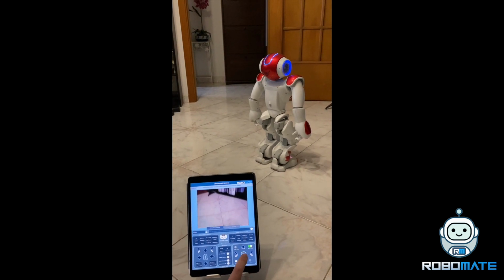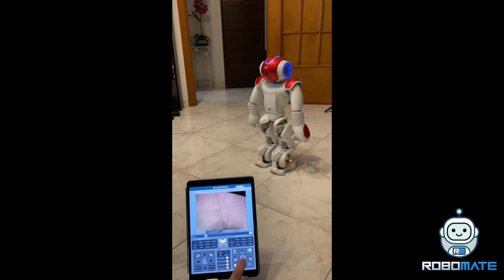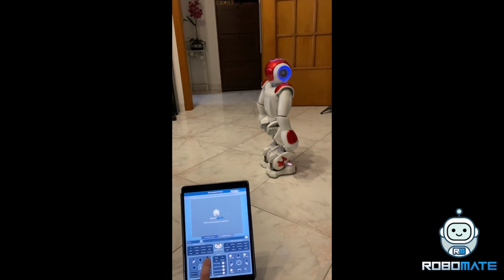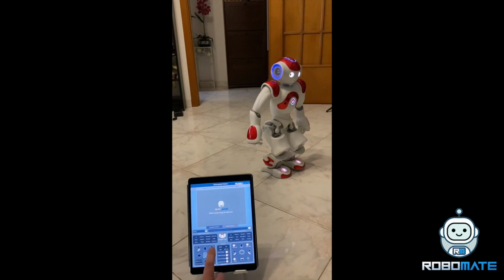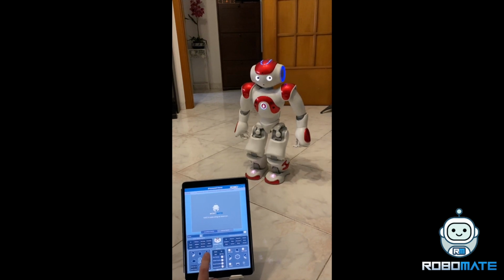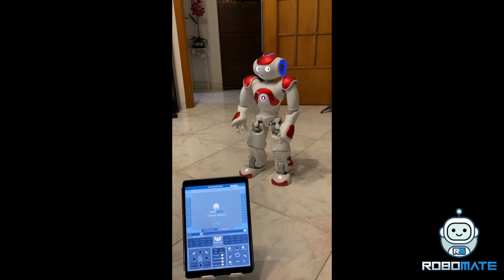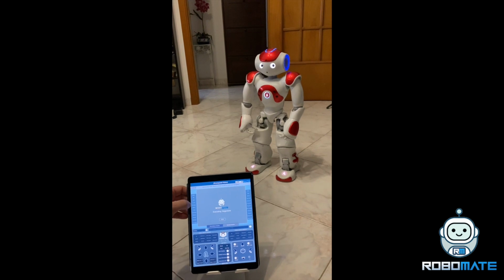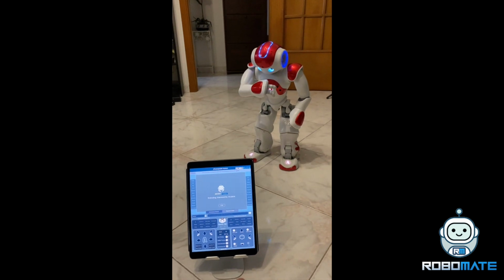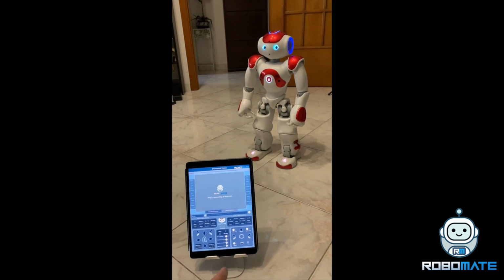So I have the streaming of what the robot sees. Also, I can execute some movements or social movements, like the robot that says yes, says no, Assolutamente no, or says I like it. Sembra interessante.